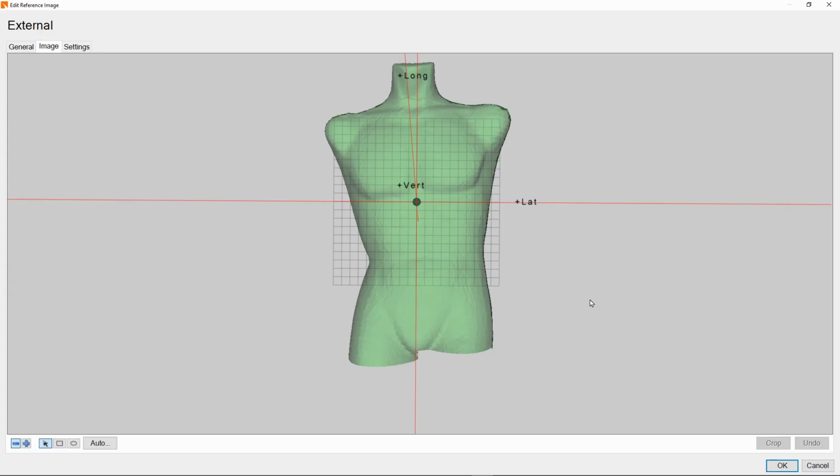Okay. Let's now move to the second option, in which you can define which parts you want to keep instead of which you want to crop. So click on the plus button. The whole active surface turns then red, meaning once you would click Crop, all of the surface would be cropped. So therefore, first we need to define which regions we want to keep.